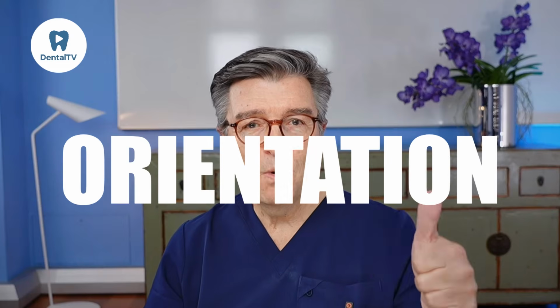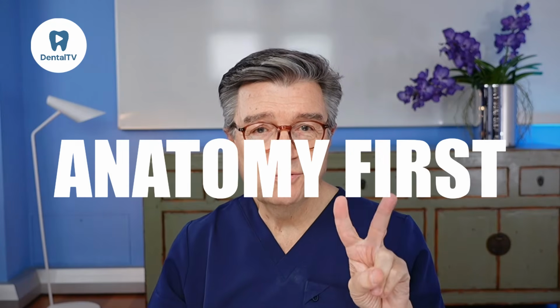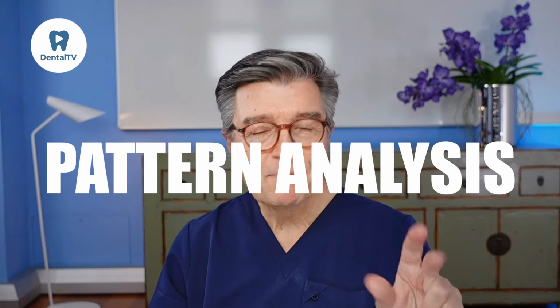Now let's connect this to the Devigus method. Here's the 4-step workflow I use every day for 2D interpretation. Step 1, orientation. What projection is this? From which direction? Which structures should appear? Step 2, anatomy check. Find your anchors. If anatomy doesn't match the expected angle, something is wrong. Step 3, pattern analysis. Shape, symmetry, borders, density, progression. Step 4, correlation. Use all available data, clinical photos, probing, symptoms, CBCT, and scans.